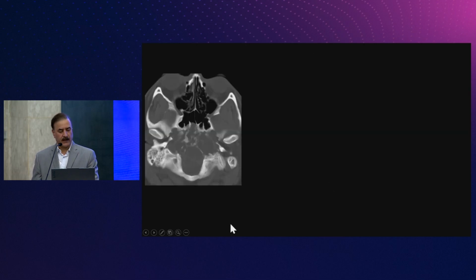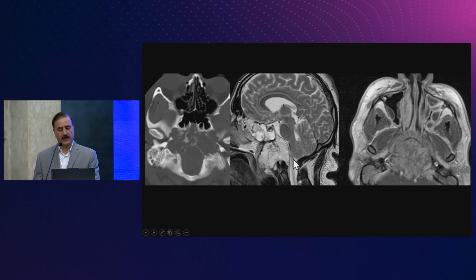Okay, now, another diagnosis, central skull base, lytic mass involving the central skull base. Like this, absolutely. You see hyperintense T2 signal, very important. Very, very important that when you have mass anywhere in the spine, not only the skull base or the sacrococcygeal region, about 18% of chordoma can happen anywhere up and down the spine. So it's very important to see the signal characteristics of this mass.